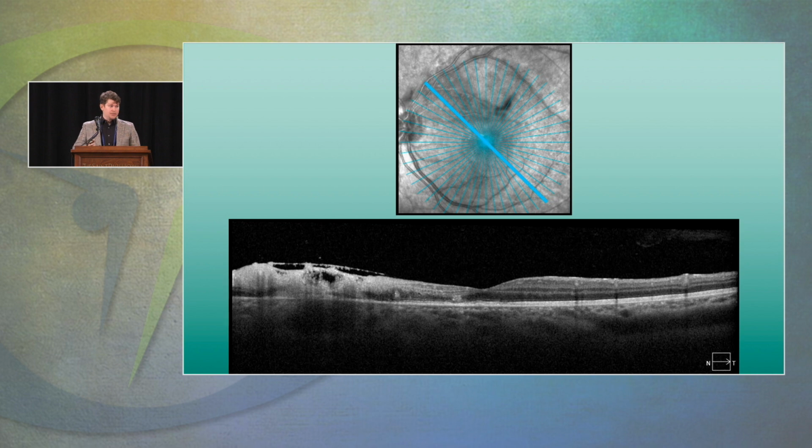She did let me do an OCT. We were talking about reserving certain tests, and if I had to pick one test to figure out what was going on here, it's not going to be Optos. I have a good exam, it's the OCT to figure out how deep this goes and is the choroid involved.